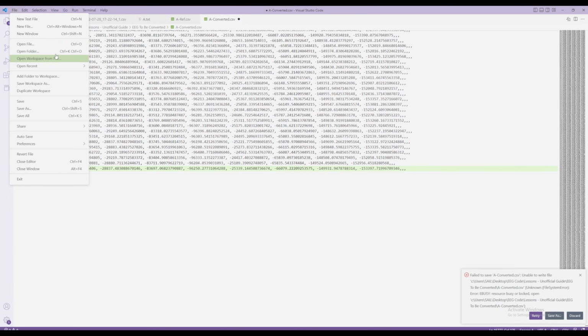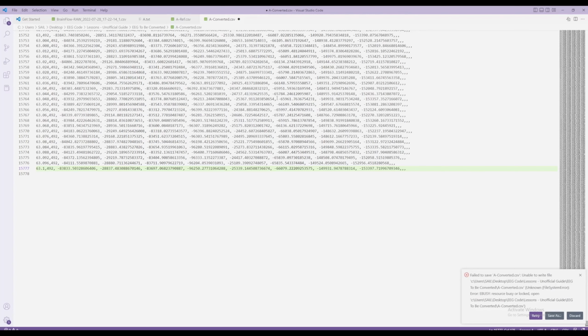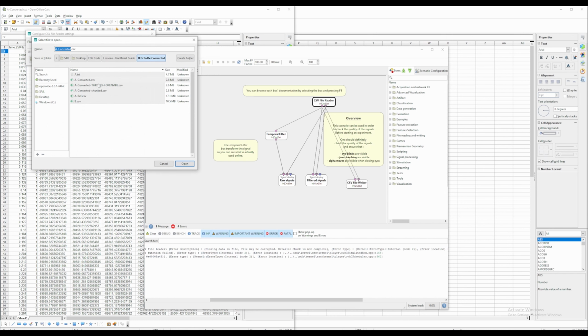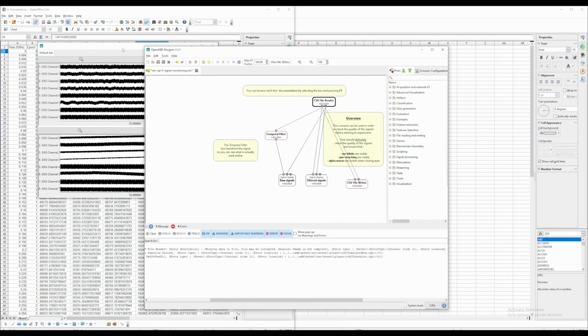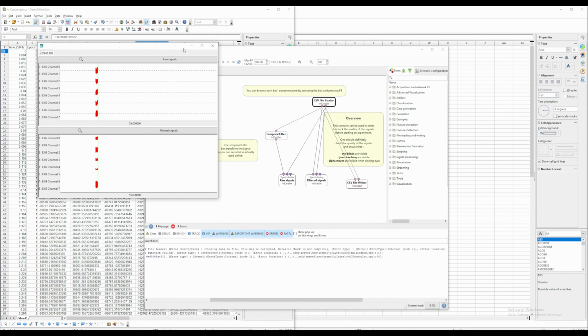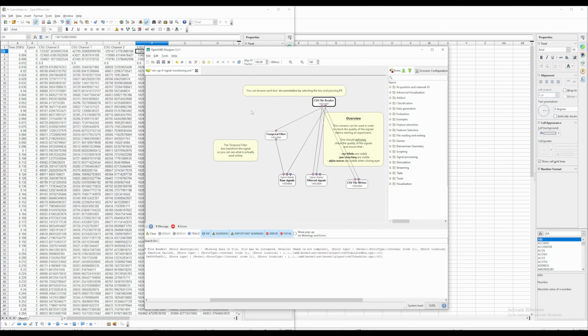Let me just save it as another file then. Converted, chunked. All right. And now if I open that, play, no problem. Fast forward, no problem. I mean, it stops at the end, but doesn't exit because it doesn't have an exit marker, but it plays through no problem.